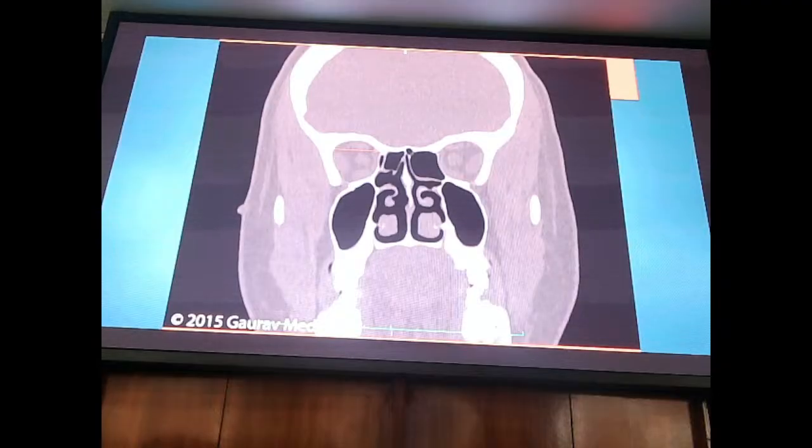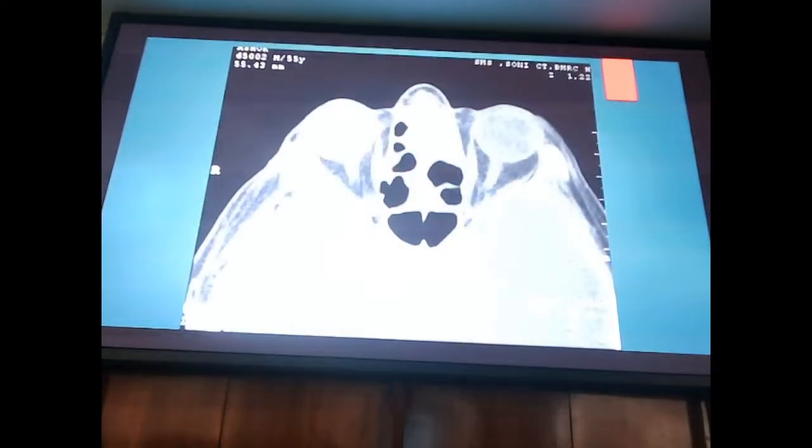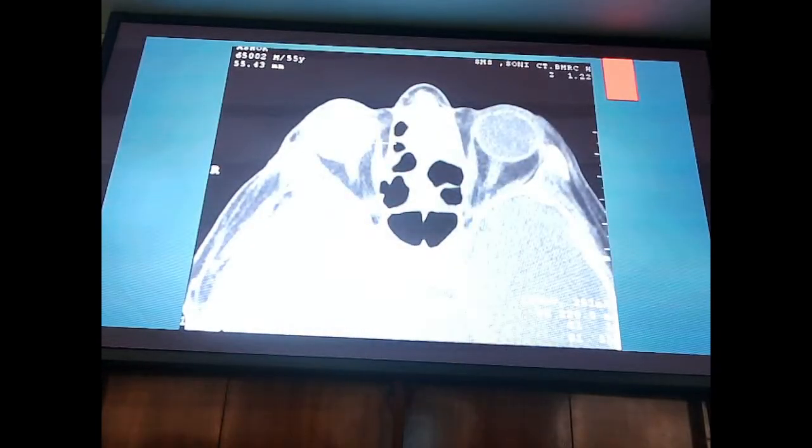This also has to do with the fact that our nostrils are anterior, so more air enters the anterior part of the nose, and that is why pneumatization is always more in the anterior segment when compared to the posterior segment. Okay, so that is the reason why it happens. Now, which is more dangerous, damaging the anterior ethmoid or damaging the posterior ethmoid? Which one? Posterior. Which one is more common? Anterior. But why is posterior more dangerous?